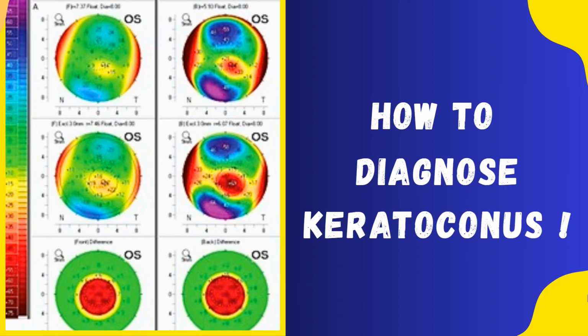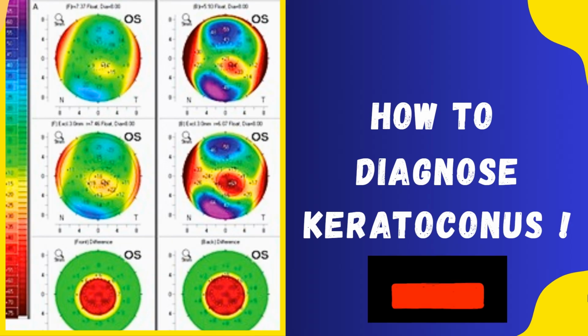Today we are discussing the diagnosis and classification of keratoconus with a specific focus on some of the more complex topics like topographic diagnosis and keratoconus indices. In this video, we shall focus on the keratoconus indices of Pentacam along with other diagnostic features.